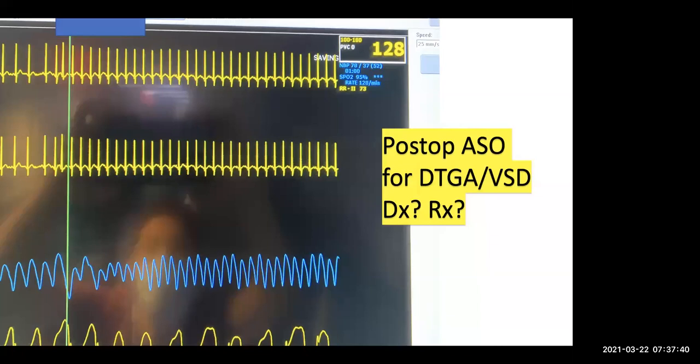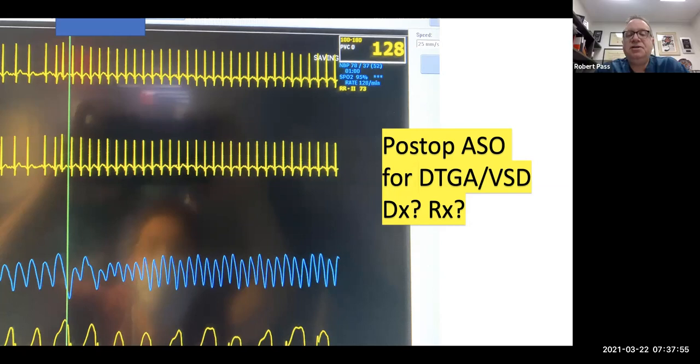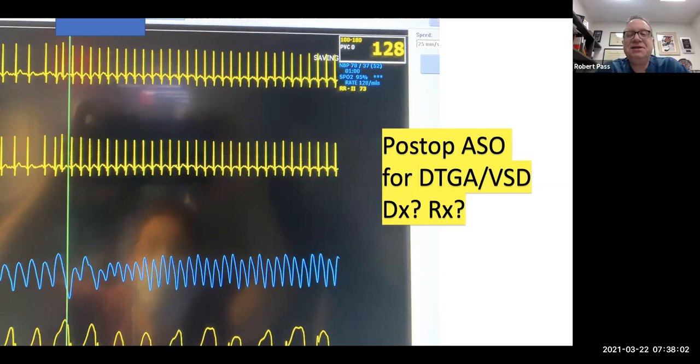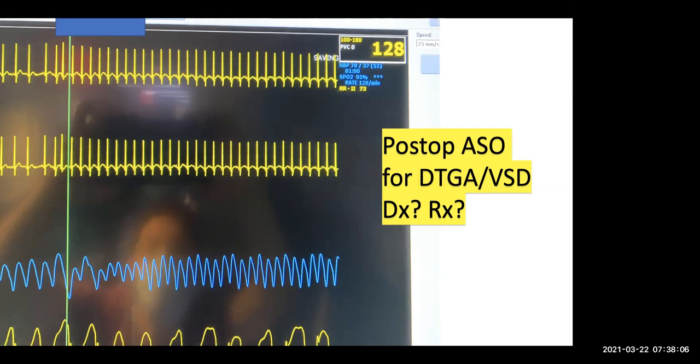So where we see the green strip, we see that there's a difference. It seems like that's actually just before the onset of the tachycardia. Dr. Paz, how old is this patient? Well, the patient had an arterial switch operation. Oh, arterial switch, sorry. So you can guess a newborn. Yeah, I can guess. It will not be a 4-year-old. Week or 2 of life, yes. So it's a newborn.